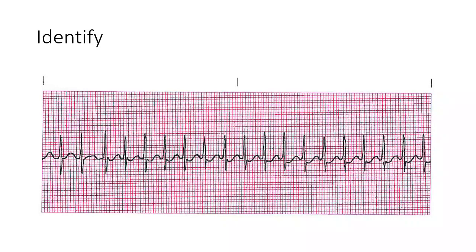It's going to be SVT. Say it again. SVT. SVT, you're exactly right. So here's the thing we're looking at. Help me understand what's the difference between SVT and sinus tach? SVT's faster. Perfect. And this is for anybody: what's the difference between SVT and VTAC?